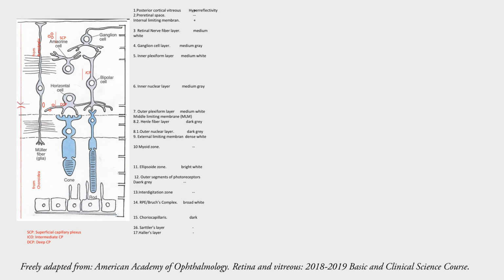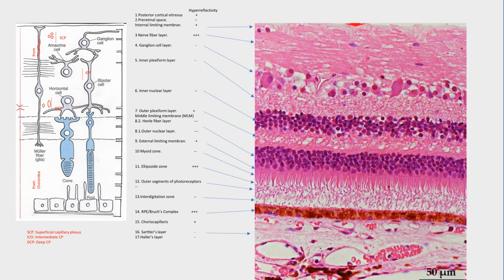Here you see what the anatomy looks like, adapted to our OCT needs. Let's add now the histology. Take all the time you need to analyze the dense slide.